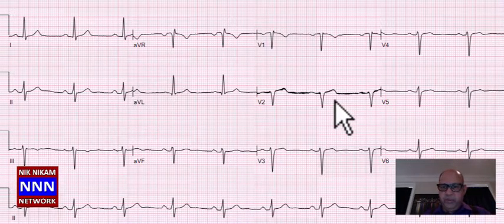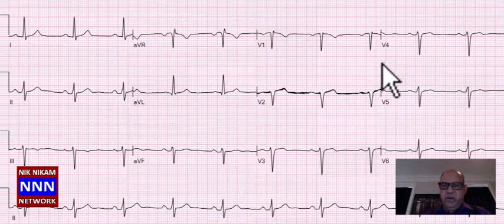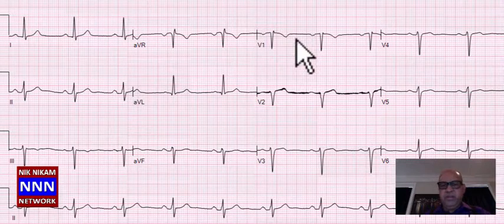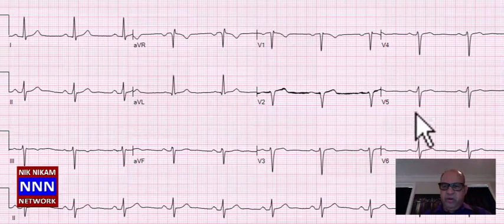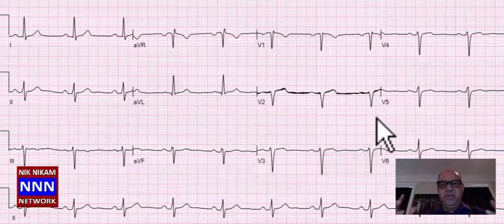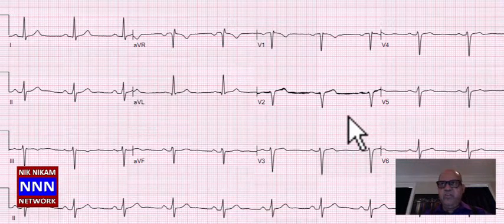It may represent chronic obstructive pulmonary disease, or it could be due to pericardial effusion or pleural effusion, which is keeping the heart away from the chest wall, thus causing the loss of R waves. That's why a clinical correlation is always indicated. EKG is just a representation of what these leads see when we record the electrocardiogram, but nonetheless, they do point to many different abnormalities.